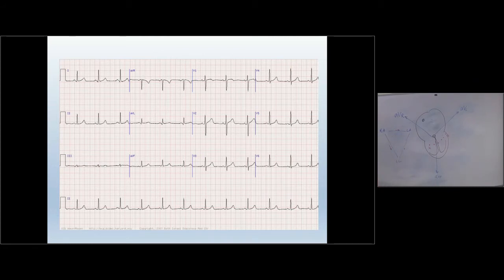Okay. Now we know this one is lead 1, this one is lead 2, and this is lead 3. All right, so there's a little bit of an easy system for you to remember, because sometimes you might get confused about which one is lead 1, which one is lead 3.